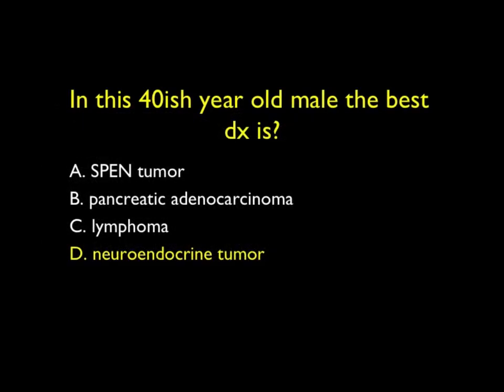I think it's a tough call. I looked at this and I said neuroendocrine tumor that's not vascular versus lymphoma. So a good thought.